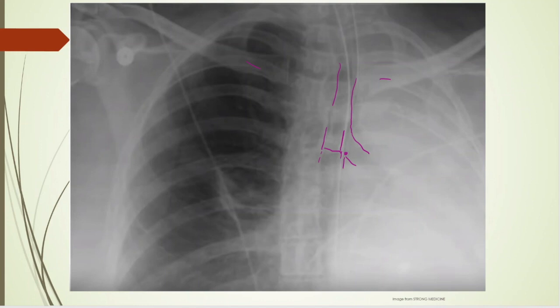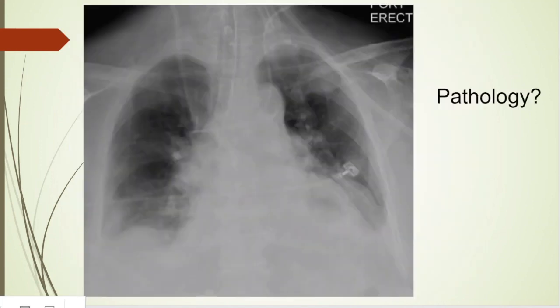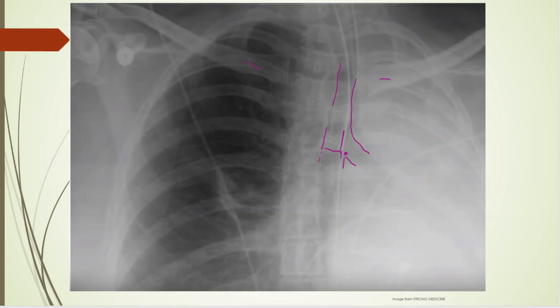And going on, bones, okay, we look at the bones. C, cardiac silhouette, well, yeah, good luck with that. D for diaphragm, oops. Sorry, I'm doing this on a Surface Book 2. My palm keeps hitting the edge to change slides. Sorry about that. So anyway, I forgot where I was, but you can see that it's right mainstem intubation, and this tube needs to be pulled back.